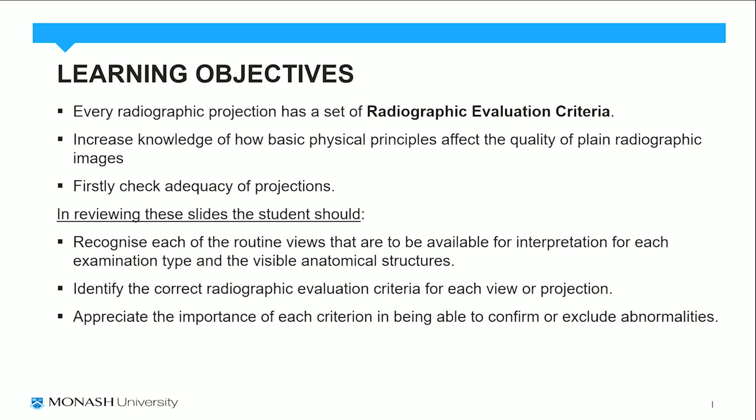The main objective of this presentation is to make you aware that there is a set of radiographic evaluation criteria, and hopefully to increase your knowledge of how some of the basic physical principles affect the quality of plain X-rays. So it is important that you check each of the projections for adequacy.